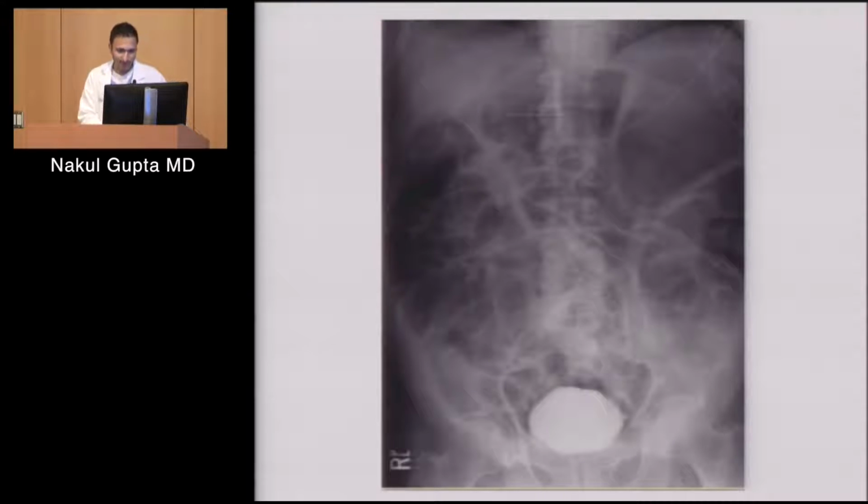All right, so I'll let you guys take a look at this for a sec and gather your thoughts. So the bladder, let's say this patient had a contrast-enhanced CT a few hours prior. So the bladder is just filled with contrast from their CT scan. Remember, the contrast is excreted by the kidneys and therefore into the bladder.